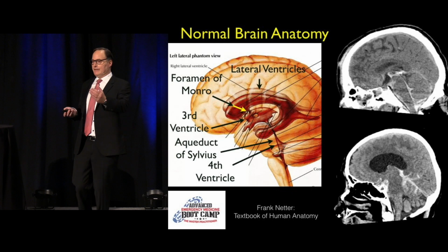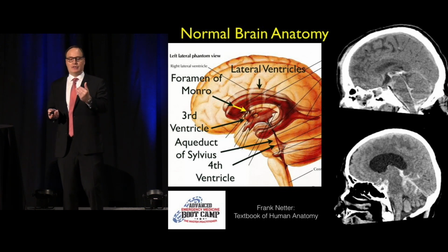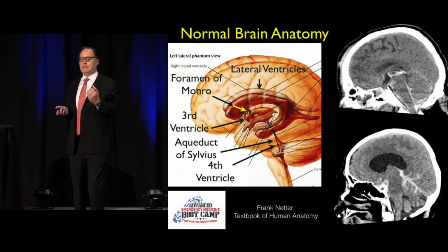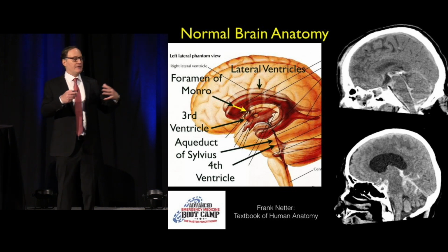And just so you believe me, to the right, I have Exhibit A, which is showing blood from a subarachnoid hemorrhage within the ventricles. And you can actually see the blood starting in the top and the continuation of the process below. Notice the blood is going down the aqueduct of Sylvius down to the fourth ventricle. And what do we see about the size of the ventricles here?